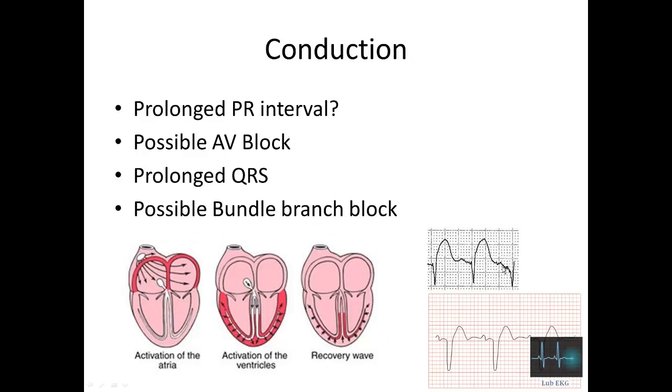Now, these illustrations here on the right, the first one, the top one, is quite a significant pathology, but if we just focus on the QRS complex here, and here another one at the bottom, you see the first one has a normal conduction. It's narrow, less than half a big block.